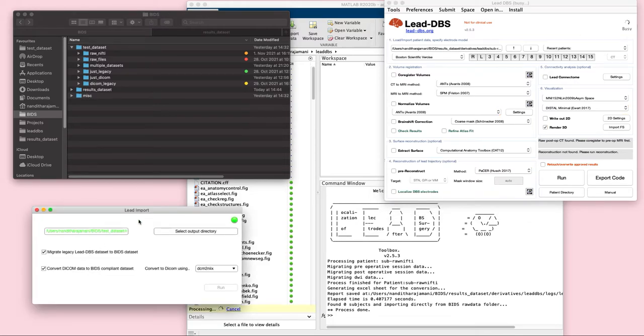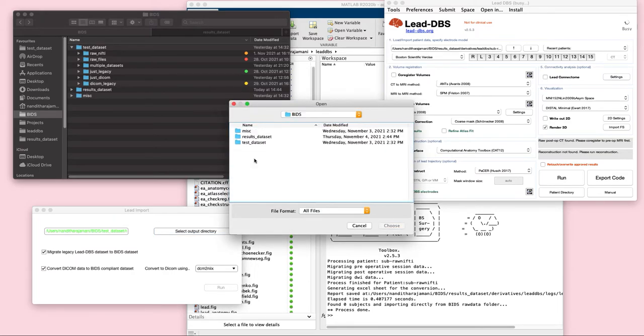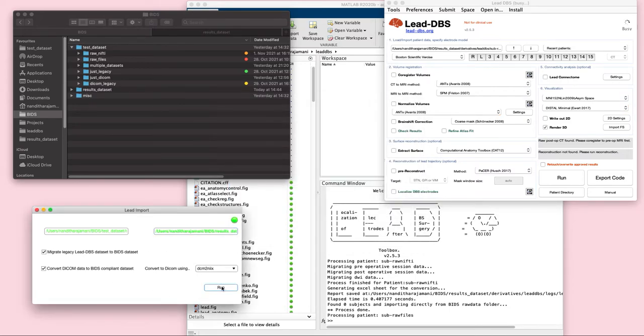And then you open the Lead import app, and as you can see, both the boxes are checked. So both the classic Lead-DBS migration to a BIDS dataset as well as converting the DICOM data to BIDS compliant data are both checked. And in the output directory, and then now you can run this.